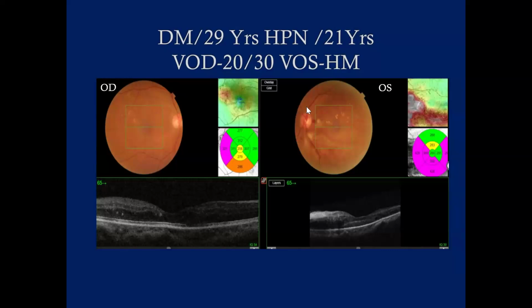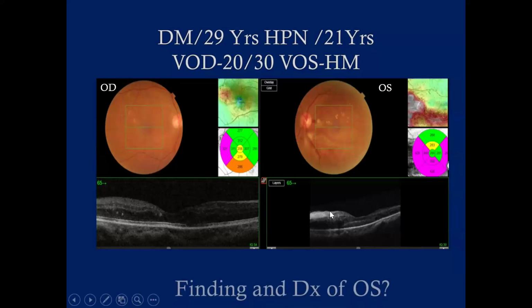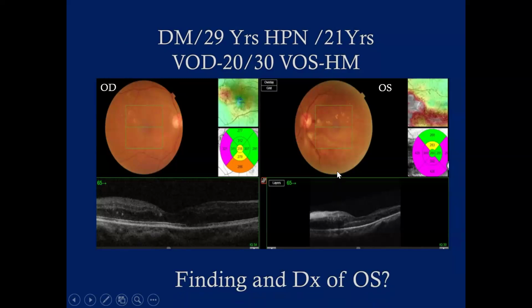This patient has, as you see here, diffuse thickening of the nerve fiber layer, and there is whitening in the inferotemporal quadrant involving the macula. So she developed a central retinal artery occlusion, and that's why she has such poor vision. It's not edema that needs injection. As you see, there is no fluid, but thickening of the nerve fiber layer. The inner layer is diffusely thickened. As you see, toward the fovea, it becomes more thinned and atrophied. And this central retinal artery occlusion may be of weeks duration, not an acute one.